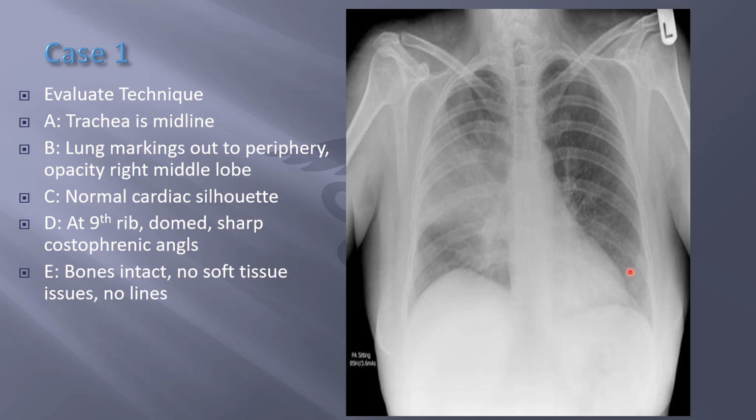You see the lung markings throughout here, here, here, and all out through the periphery there. But I do see a white density here that I don't see here. So I'm looking bilateral and I don't see it over here. I see this section here and nothing there.